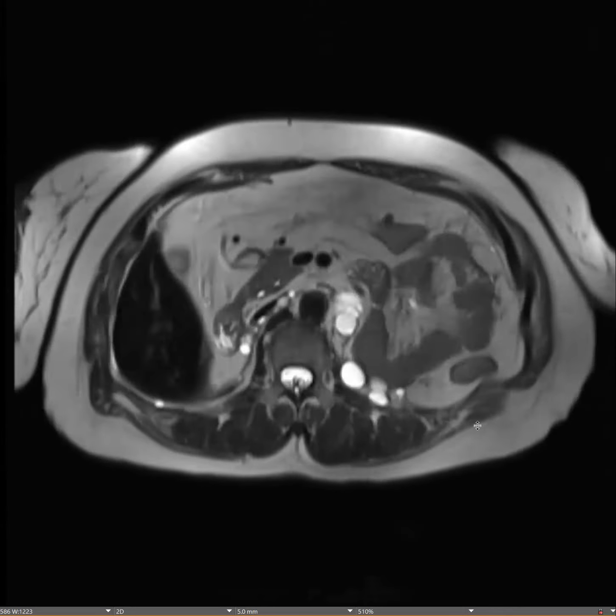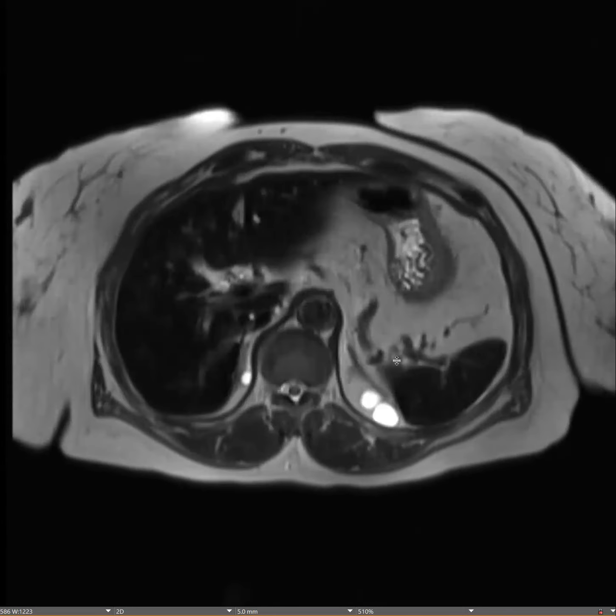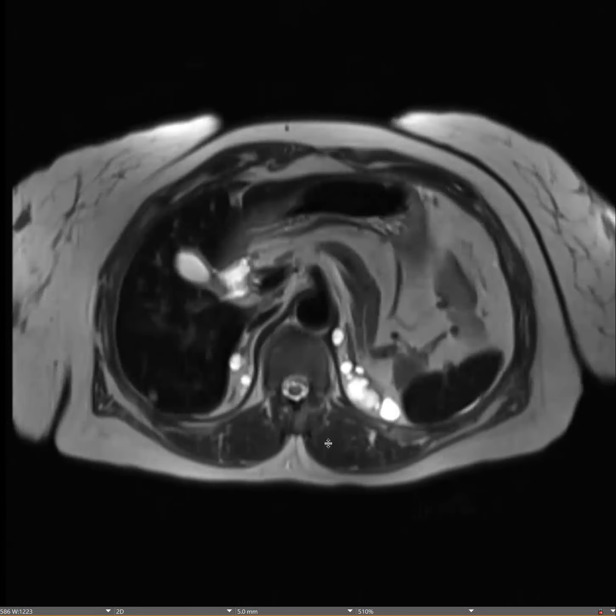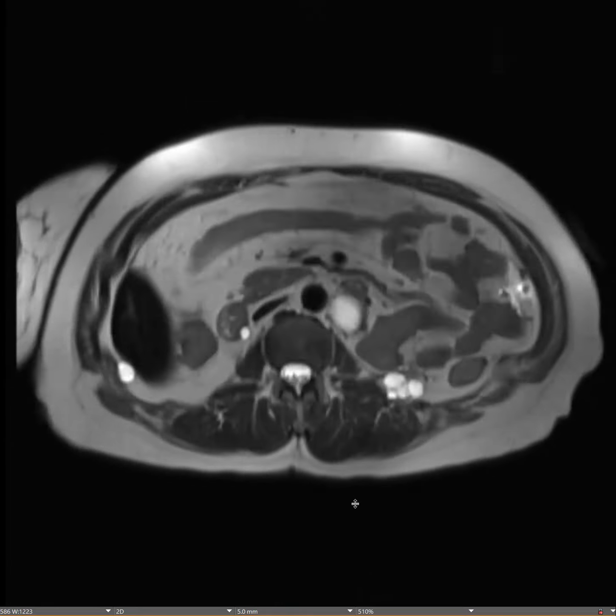If any of you have seen this, that'll be great for a consensus. I'll keep you posted eventually, if they can sample it to confirm the diagnosis. We have to see what it's going to come back as. We need the final path. This is so interesting. Any one of you have seen anything like this?